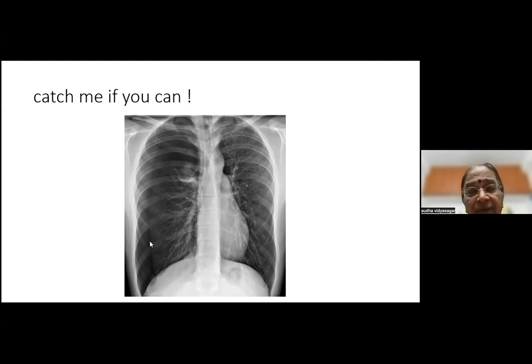That's a pneumothorax. Beyond this, there are no bronchovascular markings. This whole area, there is no bronchovascular marking. There's one here, and then this is the edge of the collapsed lung. That's what I keep trying to tell you: when you call something a pneumo, you must look for the edge of the collapsed lung. It's not very small either, about 10-20%. I'm just tracing it out for you. Beyond this, no bronchovascular markings at all.